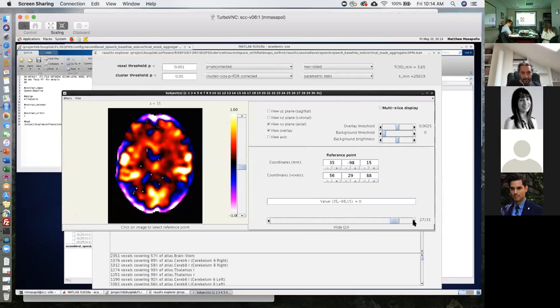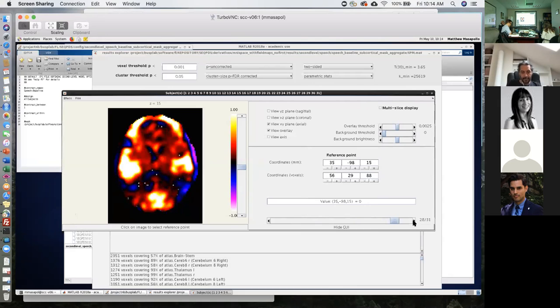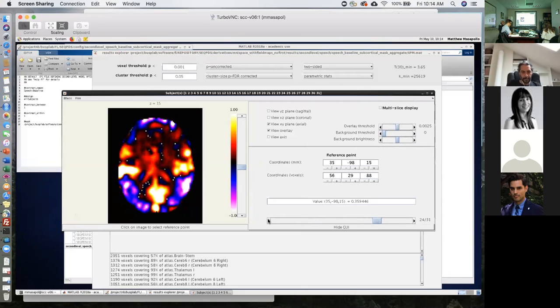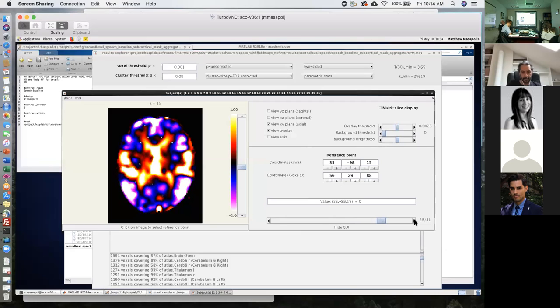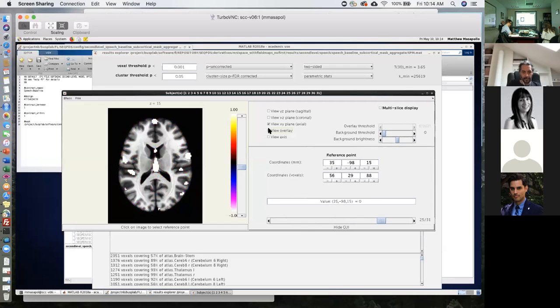That one, if you go back to, sorry. That's probably one more. What's right there? Oh, that one too. The next one. It was that one. That really bright spot. If you take the view, the overlay, take that off. It's mostly ventricle, right? For that subject. Yeah.